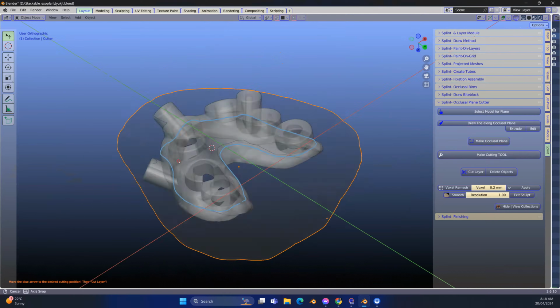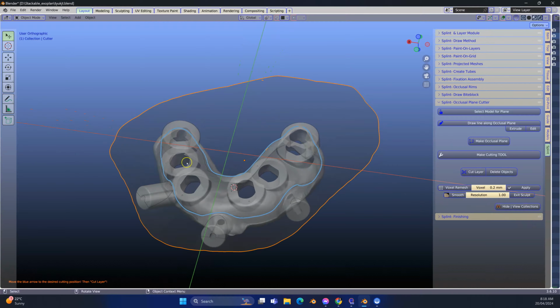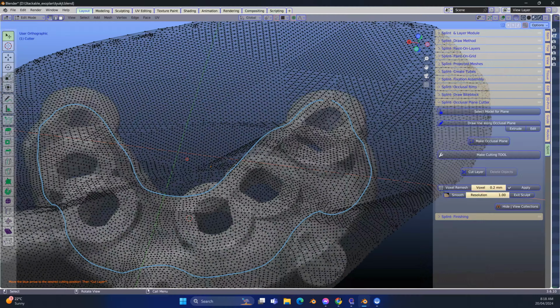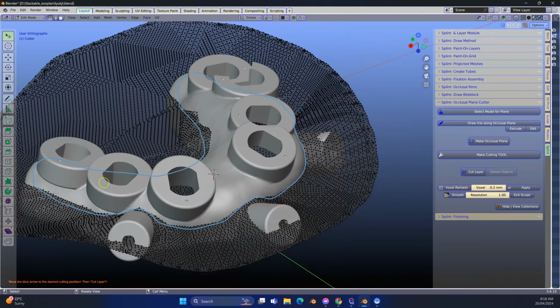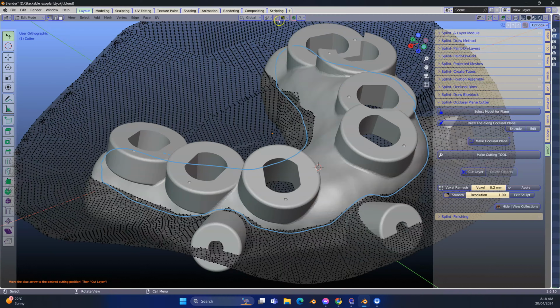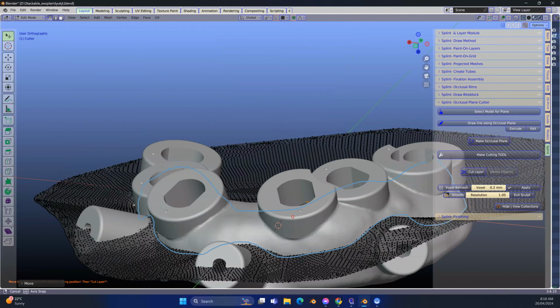as you can see. In edit mode, it is a plane with a lot of subdivisions. So you see all these vertices. And this we need to manipulate like a piece of material. Think of it as a sock or curtain or whatever you can imagine. So we can manipulate this completely.